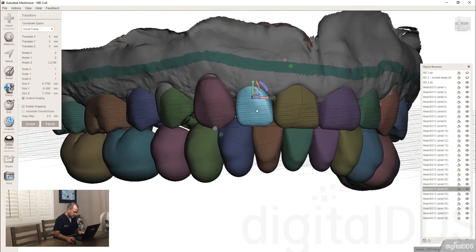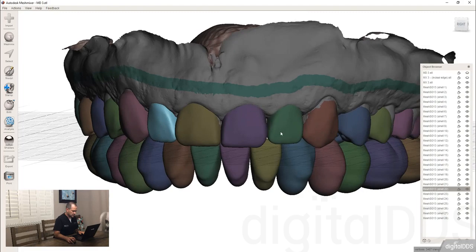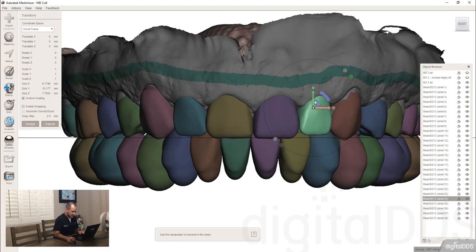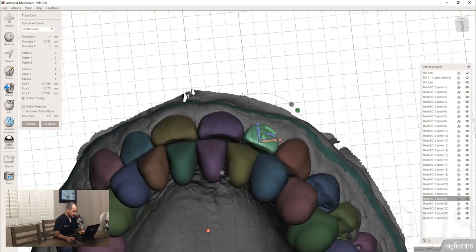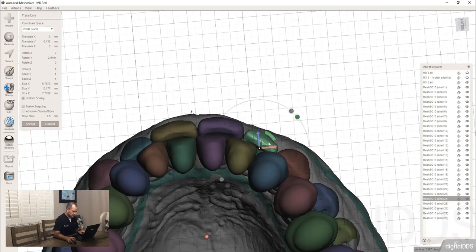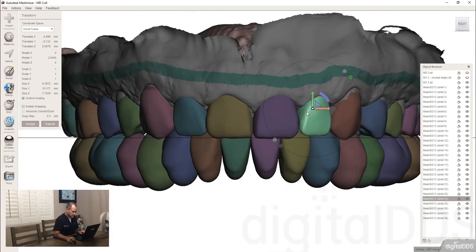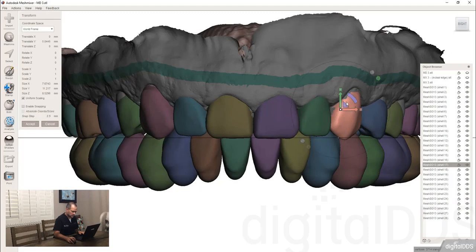So it's just another step, which is one of the things I just had to get over when I was early on in digital dentistry and I wanted to do these in-house wax-ups, and yet I did not have exocad. So I got good at Mesh Mixer. It was free. So that's just one of the things that you give up.